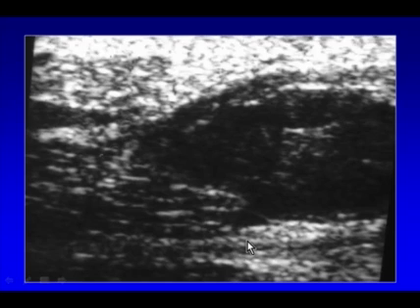Now, this is a case which taught me a lot about imaging of muscles and also about imaging tumors in general. This was a patient whose chief complaint was pulling in his quadriceps muscle when he contracted his leg. These are the fibers of the rectus femoris muscle, and they came out into this very amorphous, very poorly defined, heterogeneous mass within the quadriceps muscle. Now, this could be the presentation of a primary sarcoma, but it turns out that the patient had a history of melanoma taken out from the same extremity a couple years ago. So we were very suspicious this could be a metastasis.